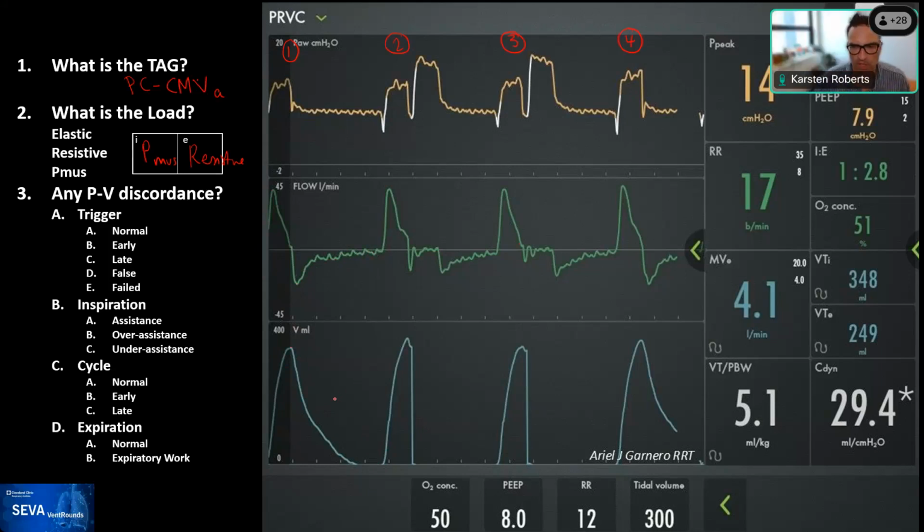Yeah, so I'll get to Ari's comment about the expiratory volume in the second and third breath in a second, but I think, to Eduardo's point, it appears, despite the PMUS that we see in the inspiratory portion of this, that it looks like it might start to go into the expiratory phase of the breath a little bit.